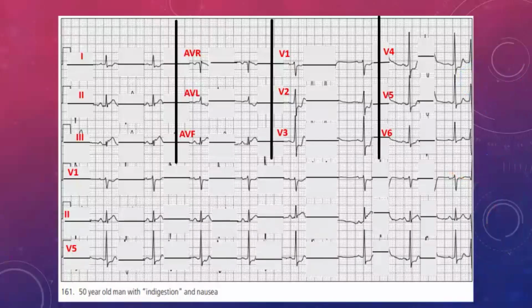So those of you who are live now at the moment, if you can just let me know in the chat if it makes sense, what I've tried to teach you, that if you can in your mind, or sometimes even physically on the ECG, you can make a second printout and scratch out all the things that you don't know, or the things that look odd or look abnormal, or things that you're not really quite sure what they are. And often when you do that, you find that you're left with something that makes a bit more sense to you and can even lead to a diagnosis.